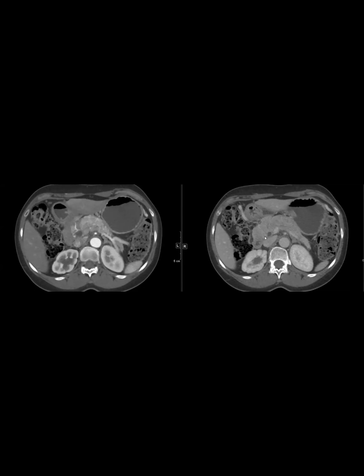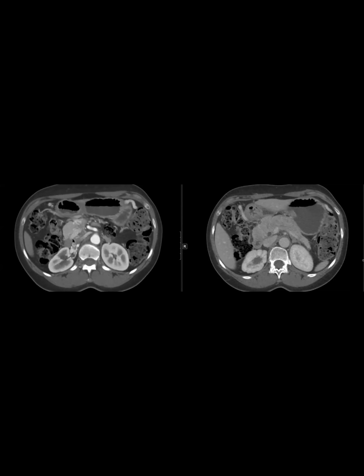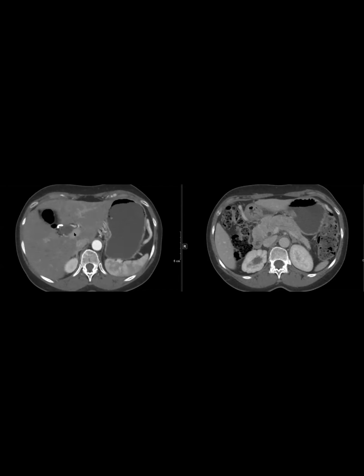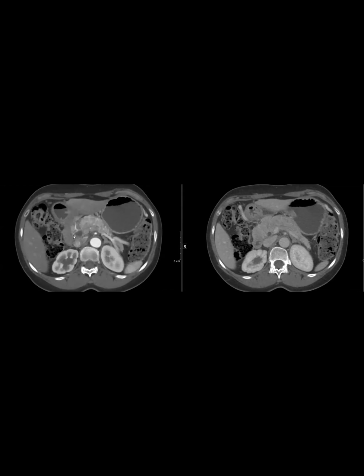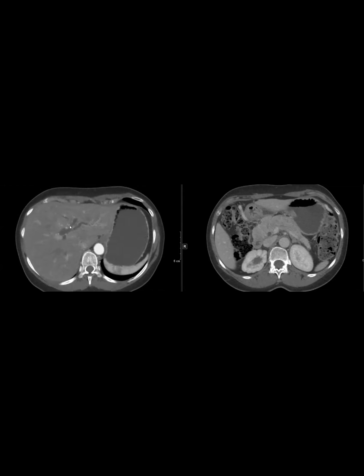Is that a little bit of dilated duct? Yeah, right here. Well, the patient had a cholecystectomy. I'm not sure this is due to obstruction or maybe a combination of obstruction.